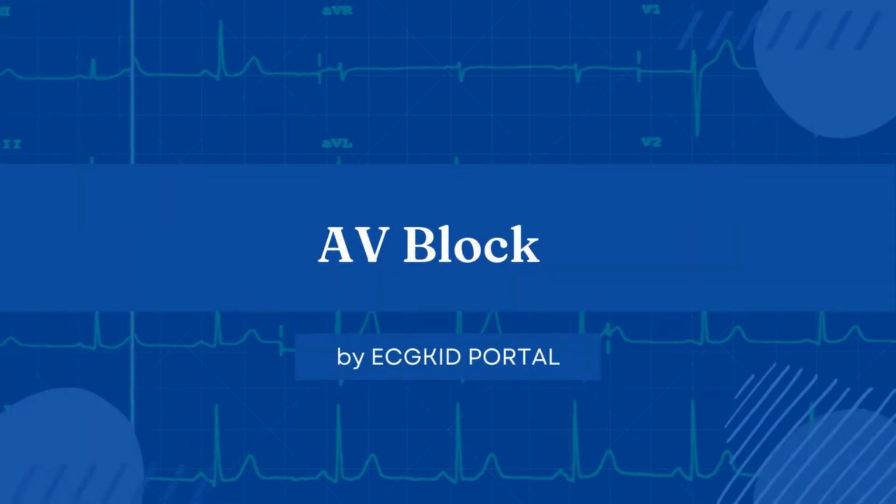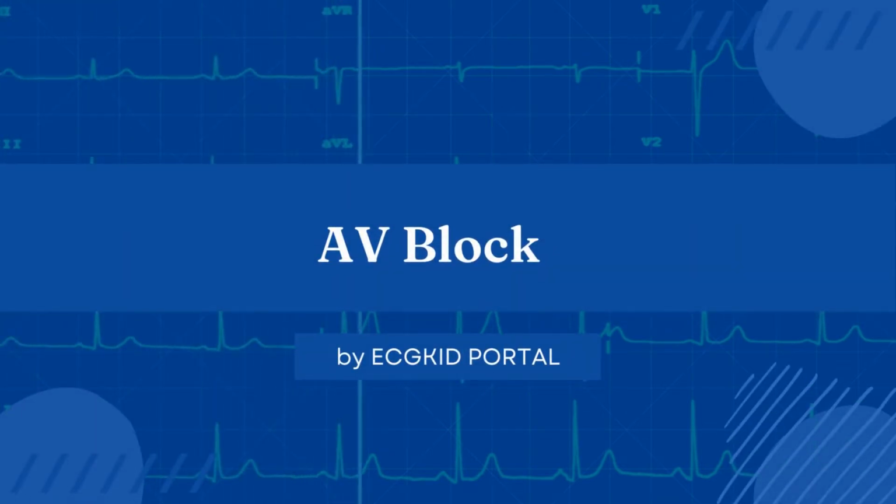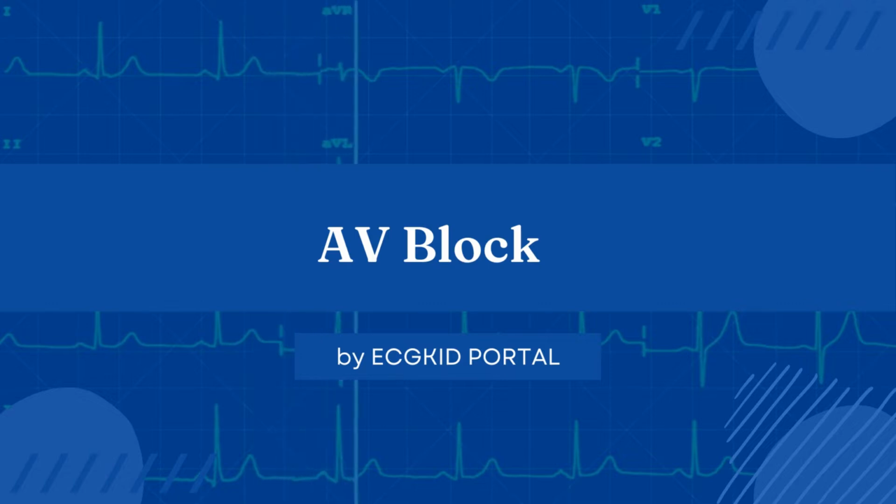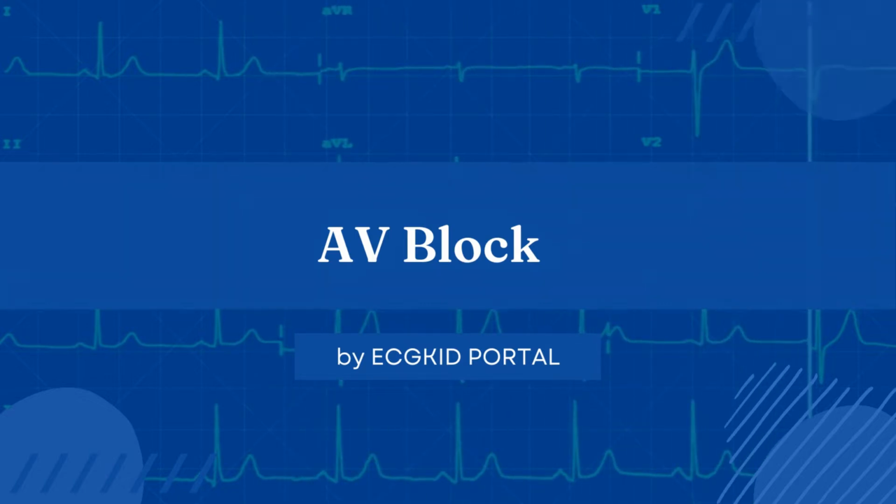This is a simulation series on Atrioventricular Block by EcgKid Portal. In this series, you will learn to analyze each type of AV block by the real-time simulator rhythm. Along the way, you will be able to distinguish the ECG features of each of the AV blocks.